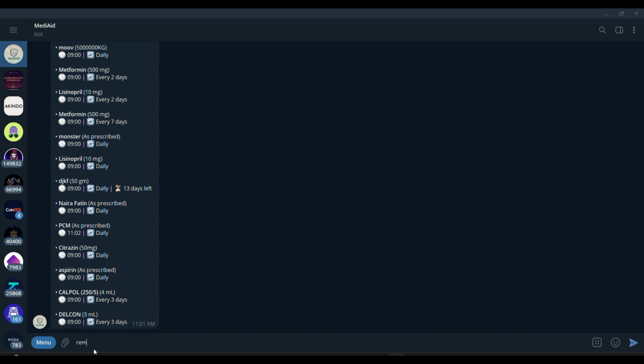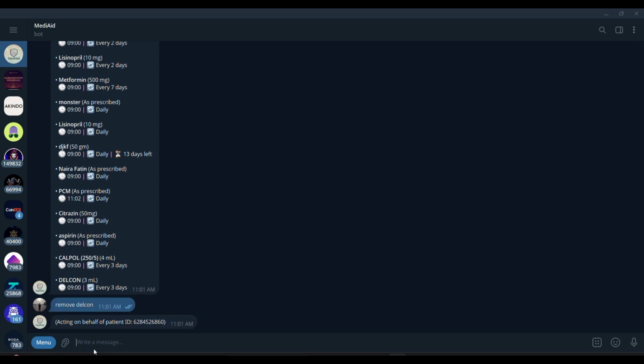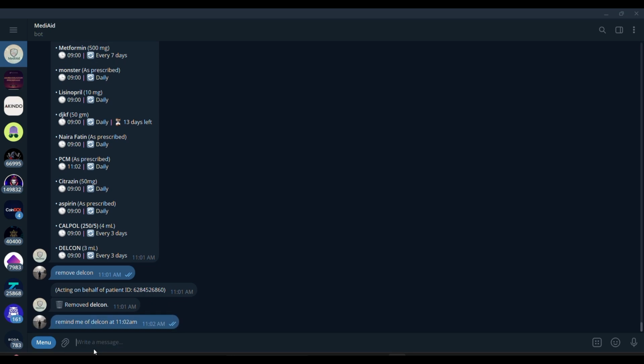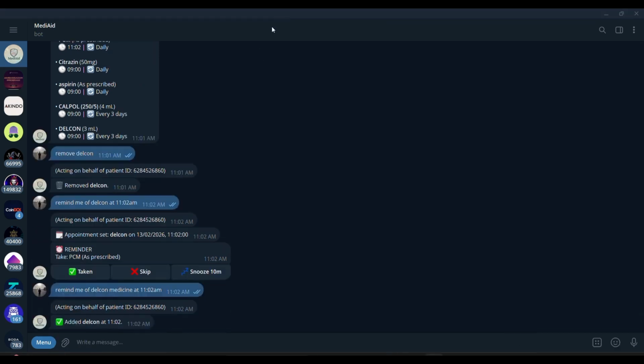Let's see. Remove Delcon. Remind me of Delcon. You can also say anything in natural English like add Delcon or anything. It just takes everything. But remind me of Delcon at 11:02 a.m. Also remove Calpol. Okay, set it as an appointment. This is something else. Yeah, sometimes the bot just mistakes medicines it hadn't heard about with appointments. This is something else. So I just specified Telcon medicine and then remind me.